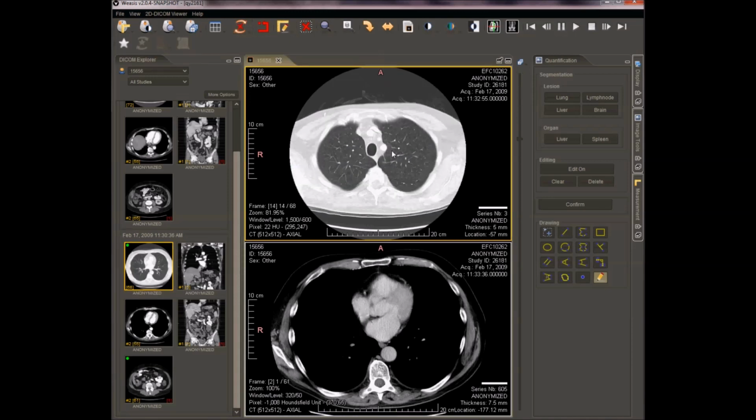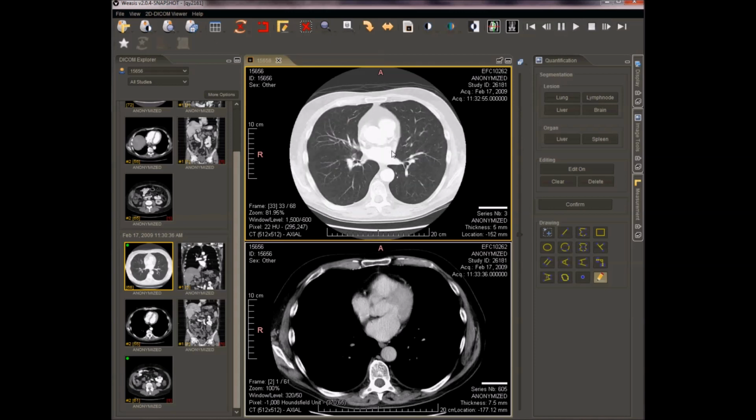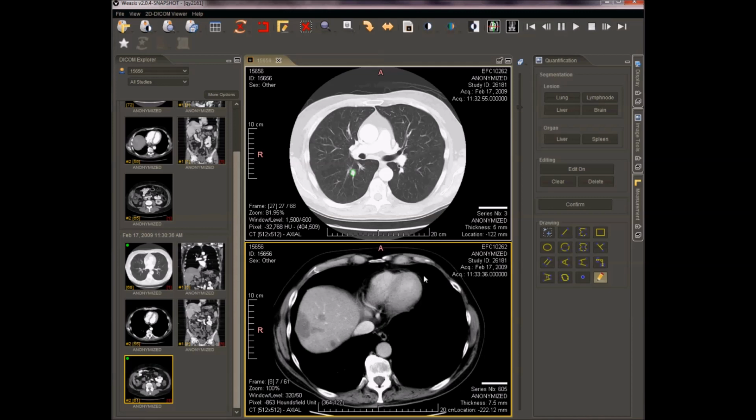We now look at the lungs in the same patient, and again notice multiple pulmonary metastases. We identify a solitary metastasis adjacent, however, to several vessels and are able to use a customized lung metastasis segmentation algorithm and segment that lesion in 3 dimensions on multiple slices.